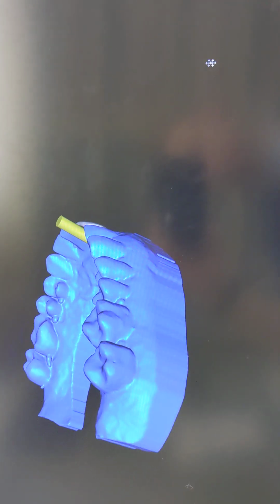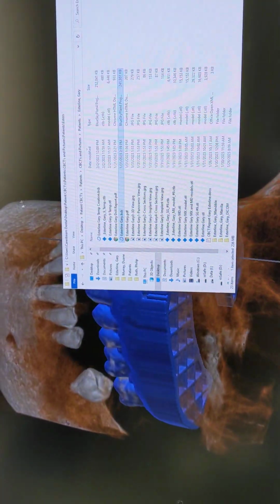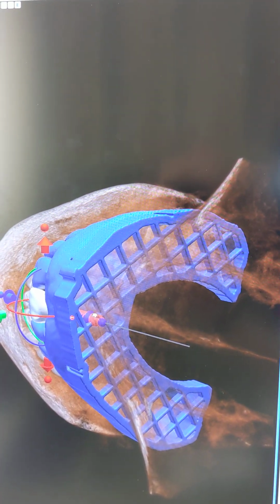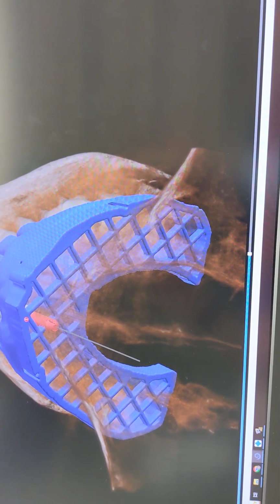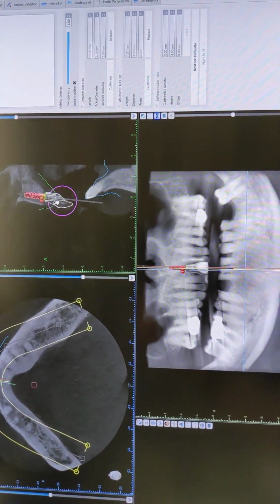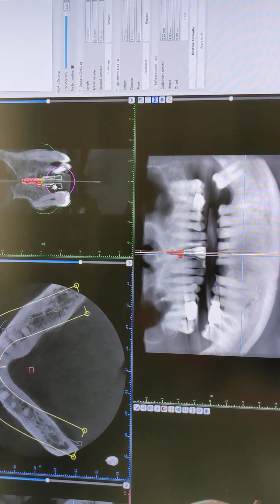Okay, well that went all the way through and it didn't really work because then I saved it, the file, and there was no hole there. Okay. So what I did then was, and I'm going to switch over to my other thing real quick here, I went in and I swapped my implant to a Biomax implant, which is essentially in the exact same spot, as you can see here, okay? So what I did is I swapped it out for an equal-sized implant, but Biomax.